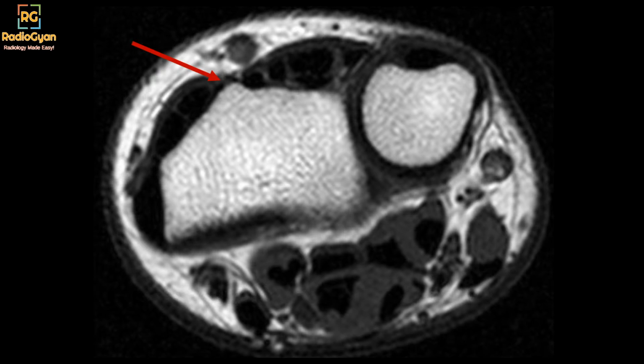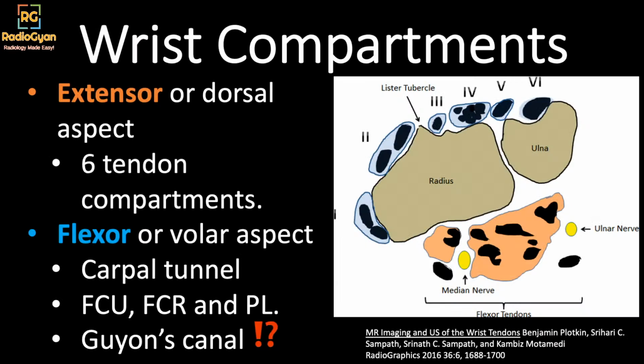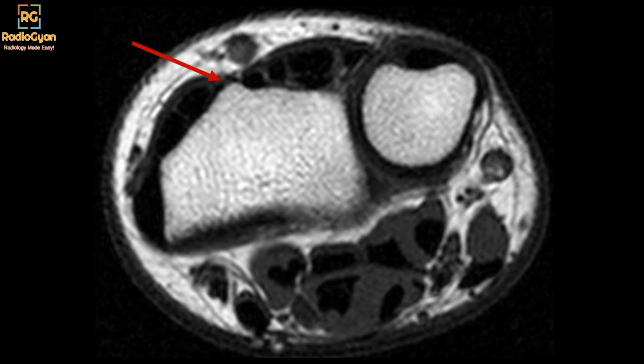Okay, so coming on to the first question that I have for you guys. Before we start the discussion, what anatomical landmark am I pointing to? What is this anatomical landmark? You guys can type in your answer in the comment section, and for those who are watching it later, you can pause the video and type in the comment section.